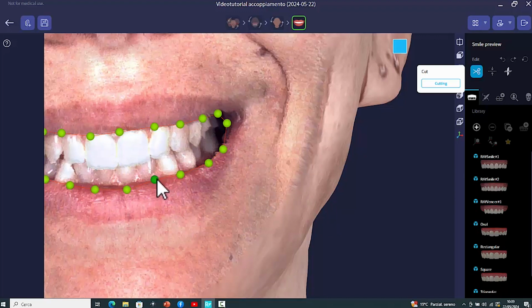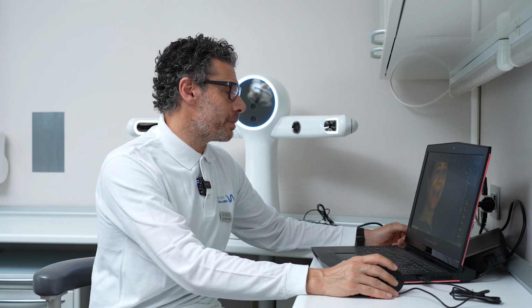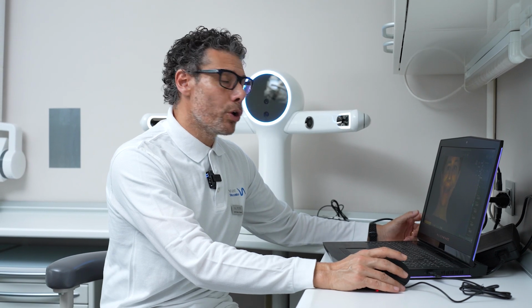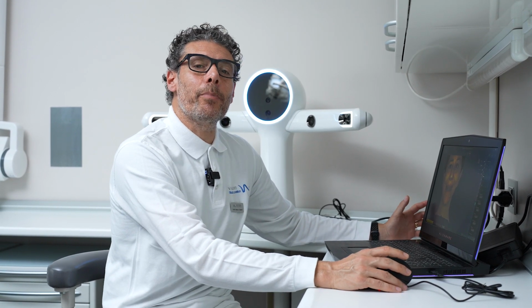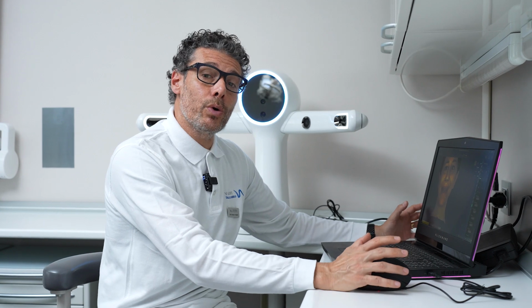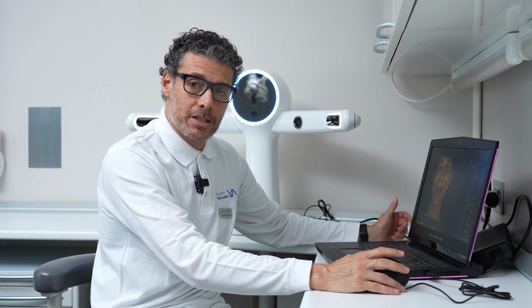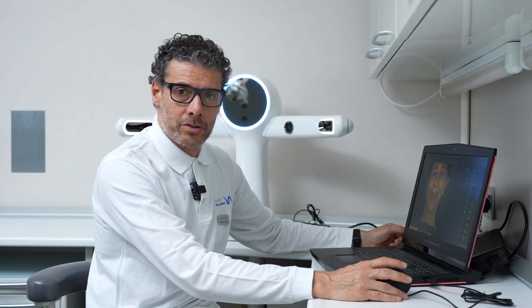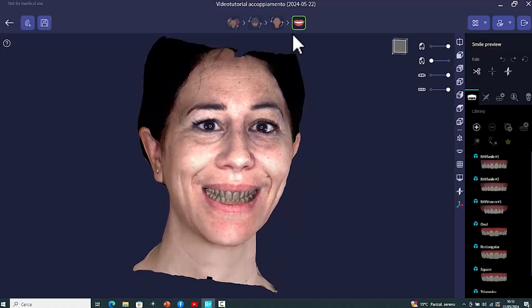The RayFace software has many other applications. We can make direct mock-up. We can then export them. We can choose from a teeth library. Today in this video tutorial, I want simply to show you how to perform a proper superimposing between facial scans and intraoral scans. Made with TRIOS, we have the scans aligned.